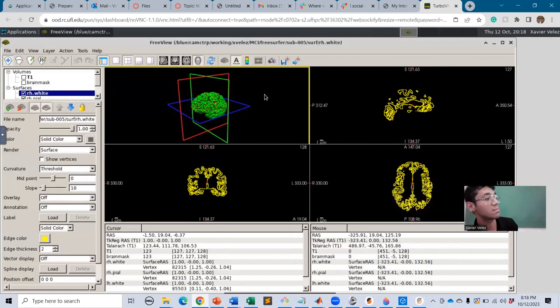And this is something that Slicer can do as well, but it's typically not really super useful for this. So my PI wanted me to learn how to segment brains, and I was like, oh boy, sure. And he told me about this tool, and the first thing that I saw when I opened it, I was like, wow, this is exactly like Slicer. It is very, very similar.